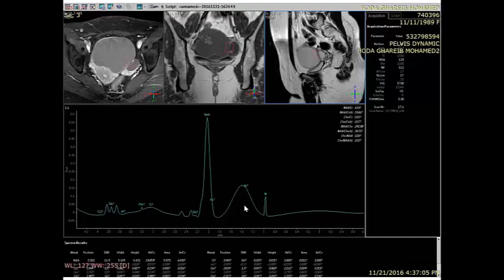Of course, with the other criteria, this is the case I have told you about. Here, there is an absent lactate peak, and being absent lactate peak, this is a borderline ovarian tumor. Here we are taking on the nodule present or the vegetation present inside the cyst.